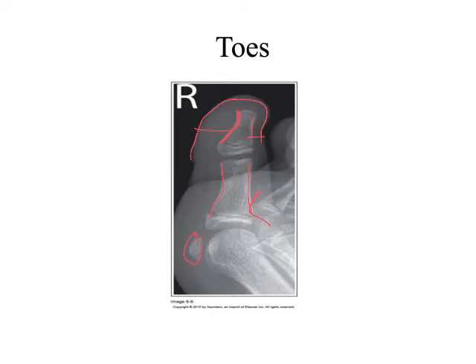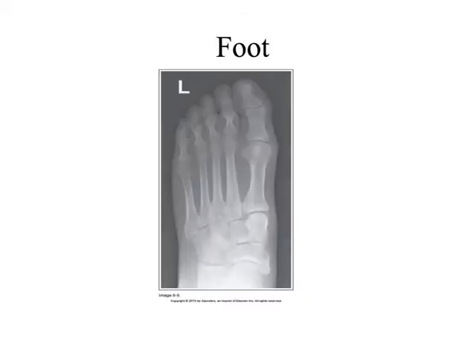And this image looks more or less like it's been centered on this bone right here, right? It's no longer centered on the joint. So in all likelihood, it was probably a difficult image to obtain because it looks like this was a child, right? We can see the epiphyseal plates. Well, let's talk about the foot.